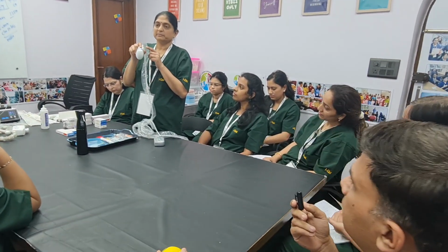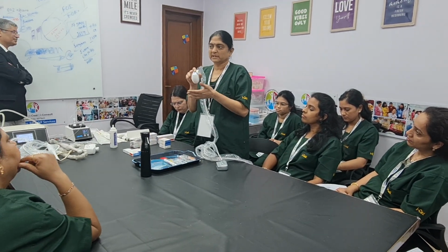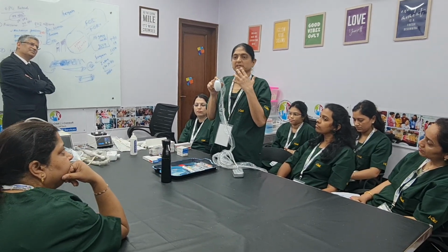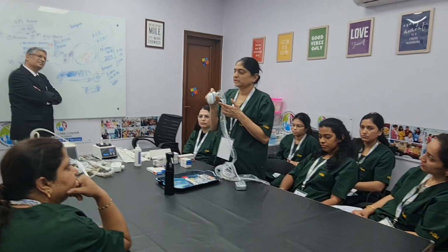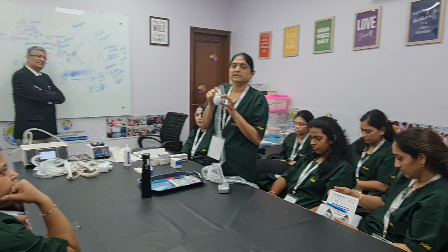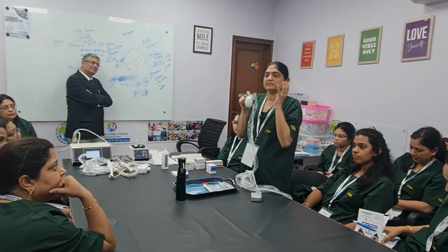As I said, 2D and 3D: 3D is not much useful in gynecological cases because TVS is much better in those. Whenever the organ is palpable per abdomen, 2D is enough, but sometimes you'll have to do 3D, especially for fetal anomalies. It's a beautiful thing where you can see the structural anomalies.